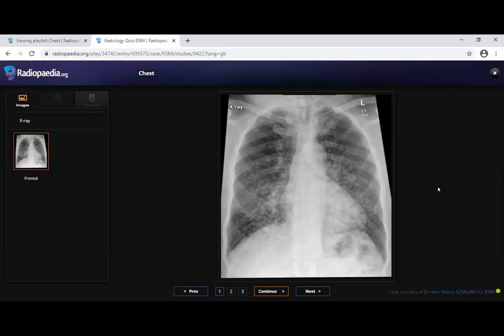I assess the axilla, the neck for thyroid and parathyroid, the bone, and any abnormality under the frame, any surgical clips. Actually, I can't see any sign of a primary. Okay, so we'll do the CT. Yes.